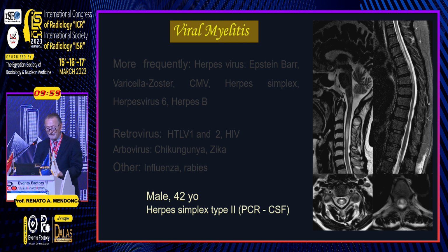The compromise is mainly in the central part of the spine. But anyway, it could be demyelination. So we have to always see the exam of the spinal cord, the brain examination, and the laboratory and clinical data. It's impossible to work without all this information.